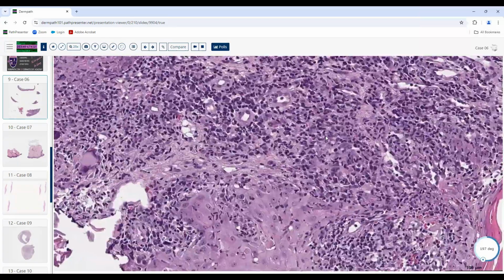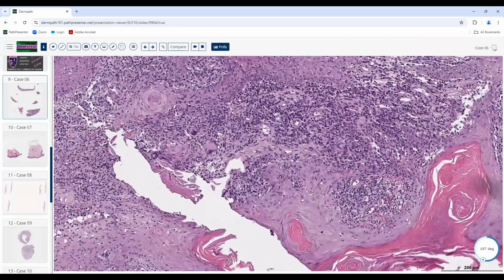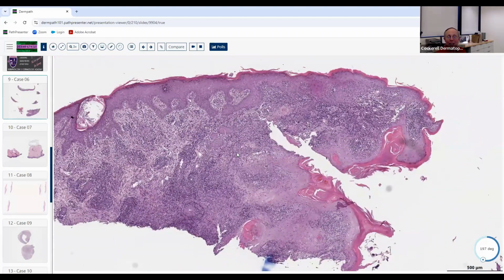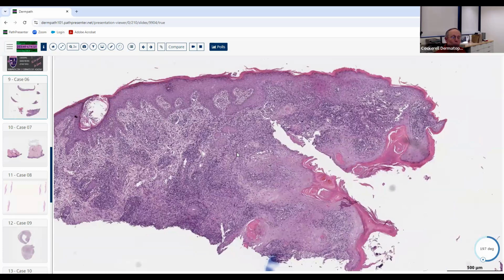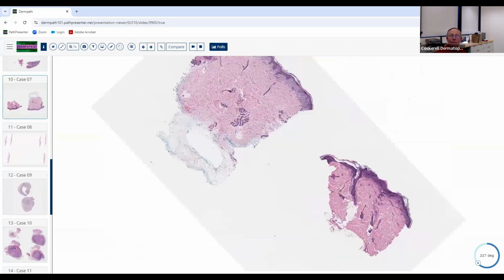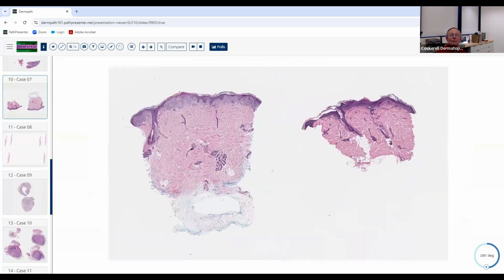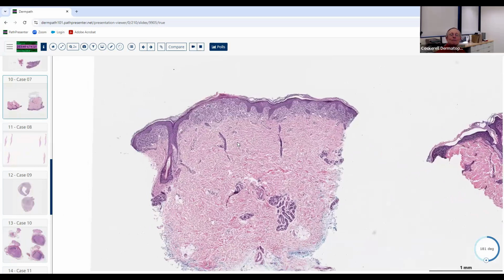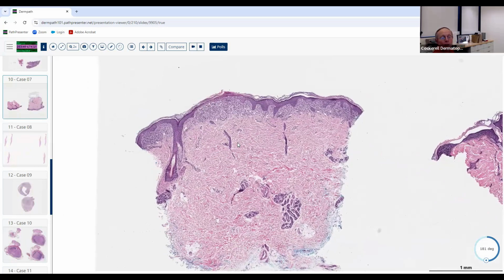Okay. So this is Cocci. So you're absolutely correct. You don't want to miss this. It's a gimme. When they show you these infections, you see it, you identify the bug, you get it right. So that's great that you got that right. Okay. This is a beautiful, fantastic case, and they very well could show you this on the exam.